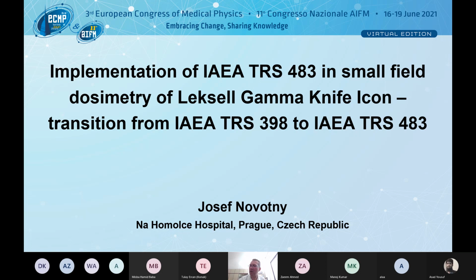For me, like distribution of 50 isocenters, I can delete, change any single isocenter. I can even add manually, individually, if we do see there is a little voxel actually not covered. Our radiation oncologists would always push, in the case of metastasis, please place the little shot there and cover it, so we get 100% coverage.